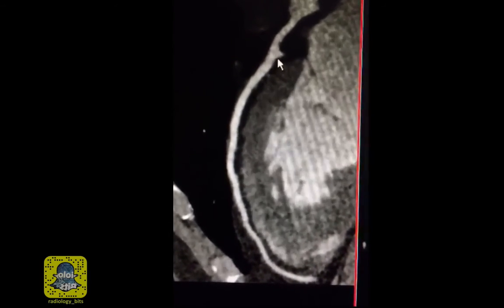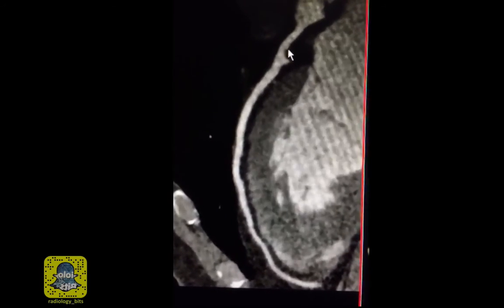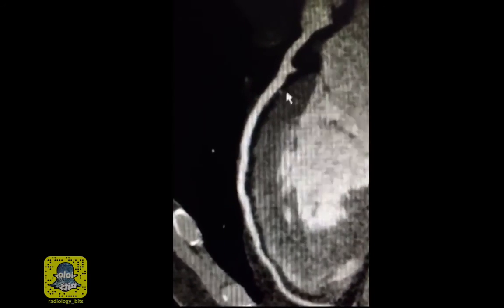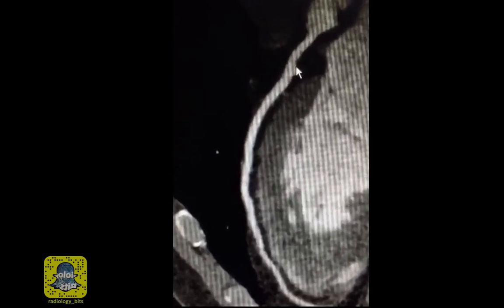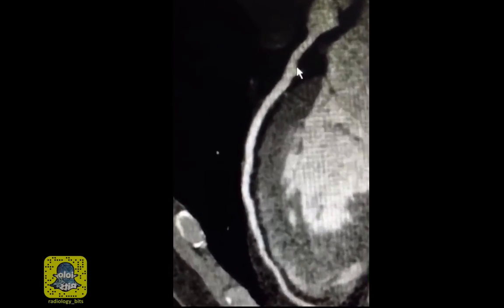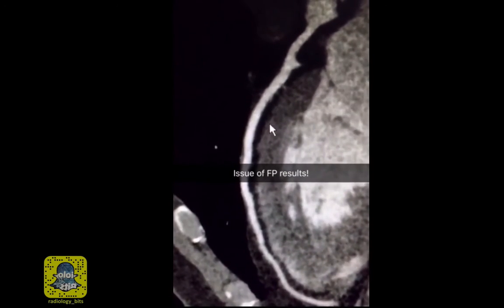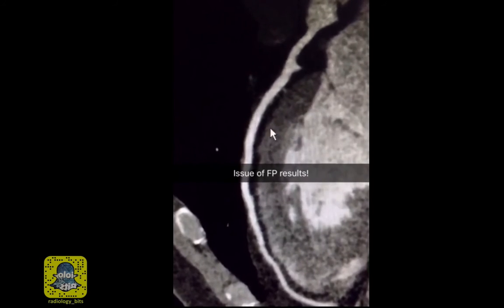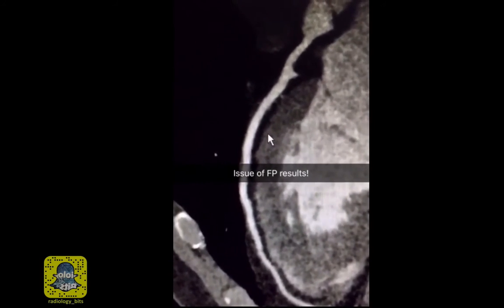For us to understand that, I'll tell you that cardiac CT is extremely sensitive to plaque. Meaning that if you have even minor plaques, that may be overcalled and may exaggerate stenosis. In other terms, this could lead to an increase in the false positive results. You'd call stenosis where it's not there.